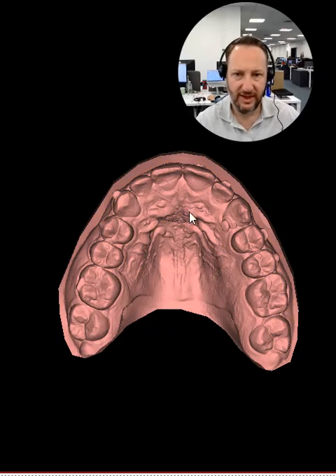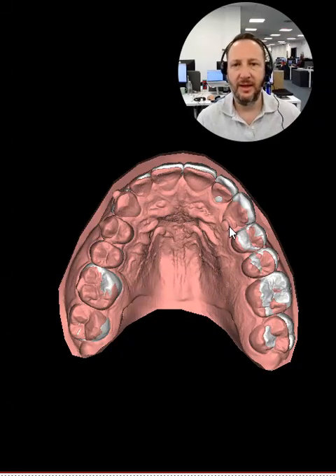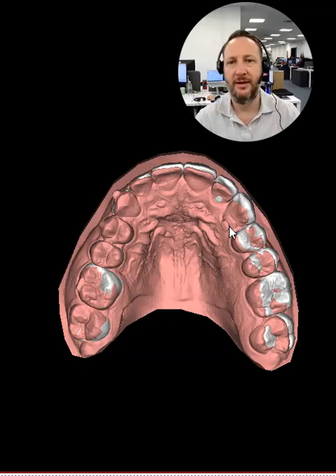Because here we have this actual position after the first set of aligners. We have the design that we want to achieve, and here we can again export and use this information to guide the Clincheck again, to keep going until we finish achieving exactly the same position that the patient already approved, that we understood as a team in an interdisciplinary evaluation is the ideal for this patient.